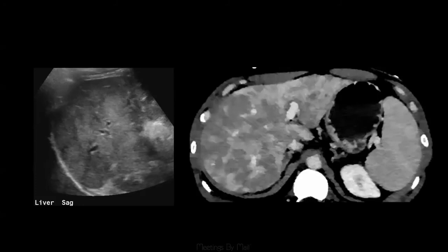So I wanted to start by showing some select images from a patient who presented with acute liver failure. Here's an ultrasound image and a correlative CT scan. And I show this to ask if any of you have seen these kinds of images. Have you wondered, why does the liver look like this? And, what should I say? And if you answered yes, then pay attention to this talk, and I hope to be able to give you some insight into this disease.